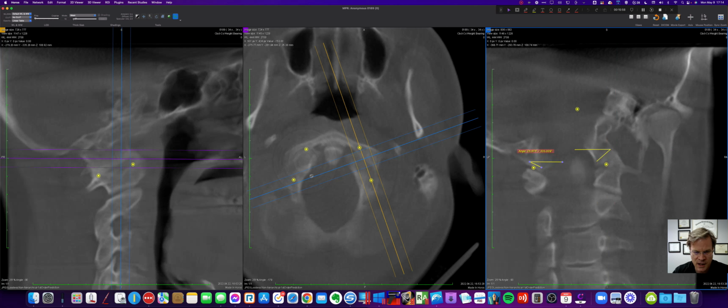You can see this blue line. We're catching the very end of the convergence angle. Now, many doctors have started using this over here because we can actually see the convergence angle of the right side much clearer, and it's a much more accurate angle. And it doesn't seem to have been an experimental thing. I think Dr. Blair just was worried about using too many x-rays, and so that was close enough that we didn't have to take more x-rays to come up with the angle over here.